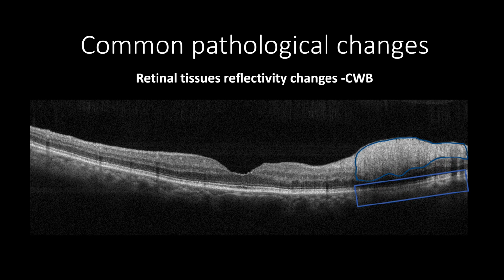They are less uniformly organized as in sub-ILM hemorrhage and less likely to cause indentation or displacement of the rest of the retinal tissue, with less effect of shadow artifact.